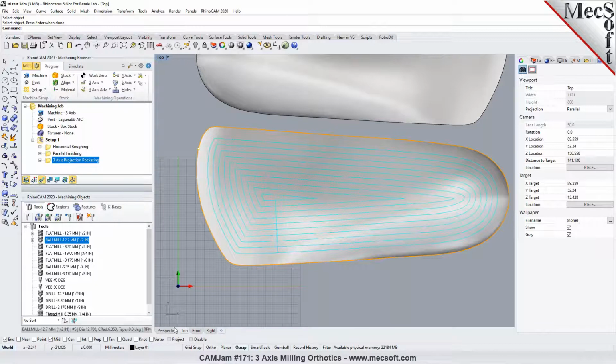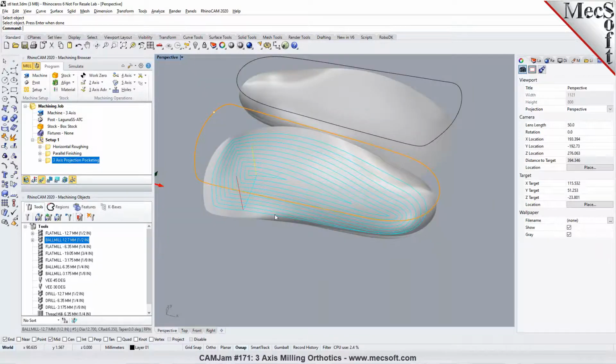Now, you also have a need to machine the part from multiple different sides, like machine from the top, flip it over, do machining from the side, bottom. Okay. So do you have a need to do that? Sorry, I missed that. Yes. Okay, all right. Now, what I'm going to do here is I will go ahead and give you an example of a couple of other parts.